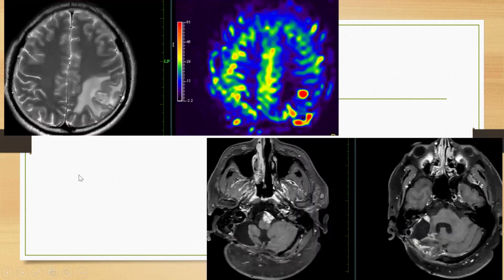This is another similar case, two more cases with similar diagnosis we saw. One more case with a left parietal lobe enhancing lesion with significantly raised perfusion. This also turned out to be intracranial mesenchymal tumor. This is another case, an adult patient with a right cerebellar lesion. Actually, it was initially thought to be meningioma and was treated. In the follow-up period we saw multiple dural-based metastases. Surgery was done, and it turned out to be intracranial mesenchymal tumor, fusion possibly.